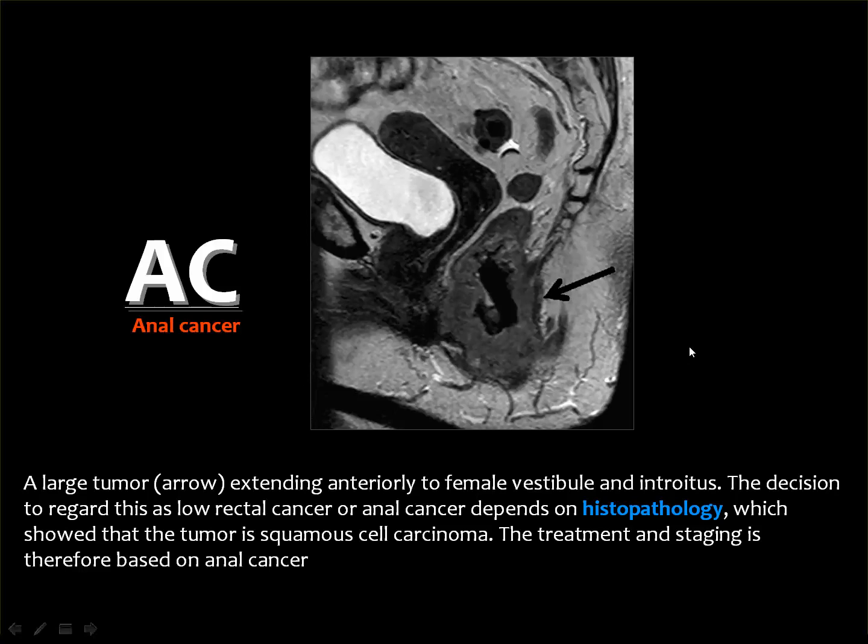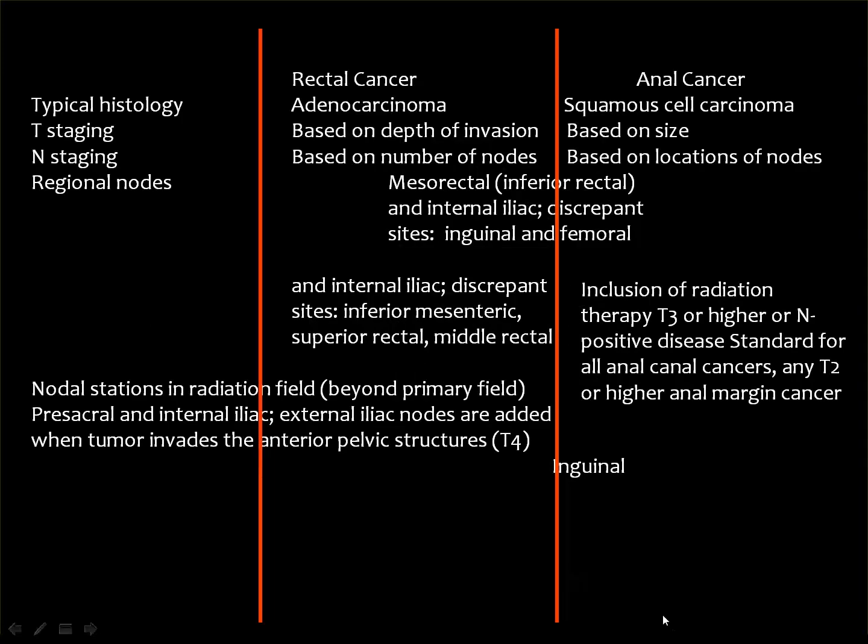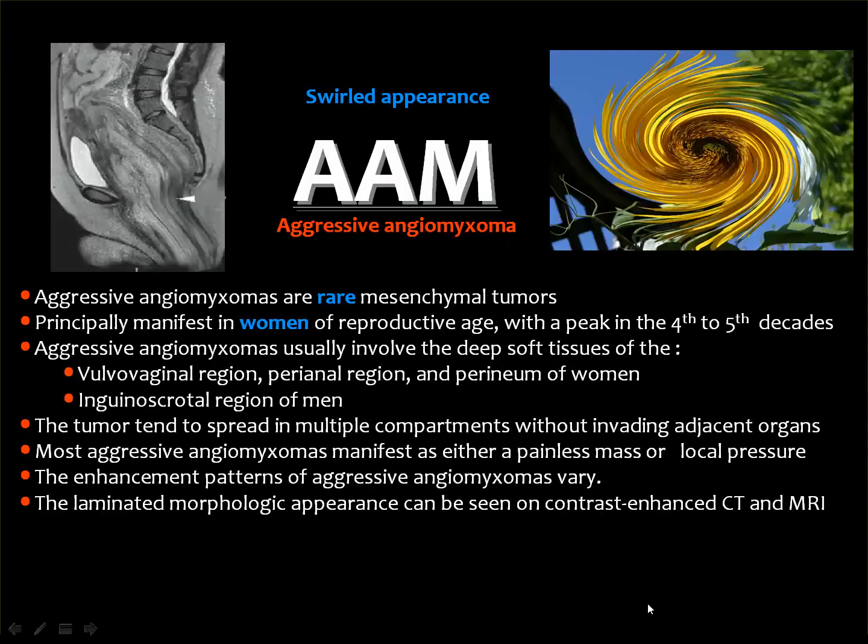Then you will say that I have mentioned that about 10% of the anal tumors are mucinous adenocarcinoma. But I will say after that that most of these lesions are tumors coming from the rectum invading the anal canal. Then we came to one of the lesions that is reported in the literature to be a rare type.